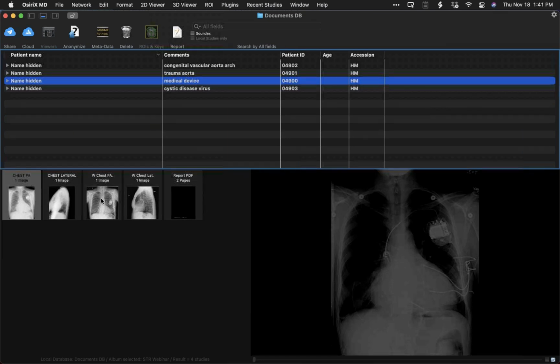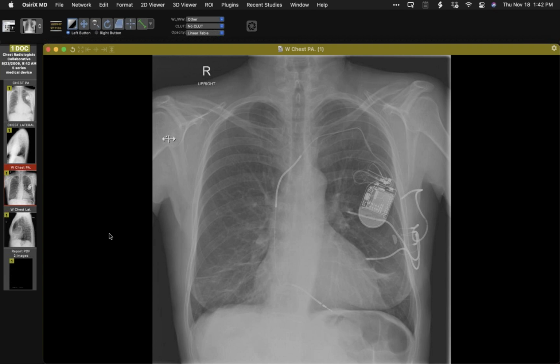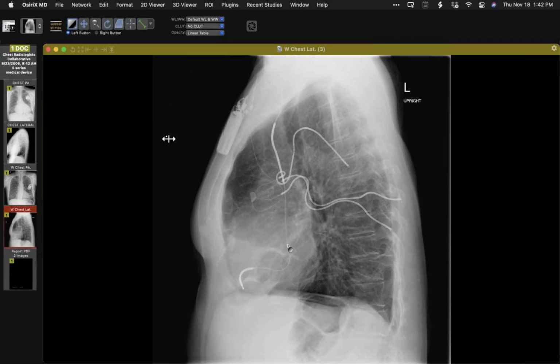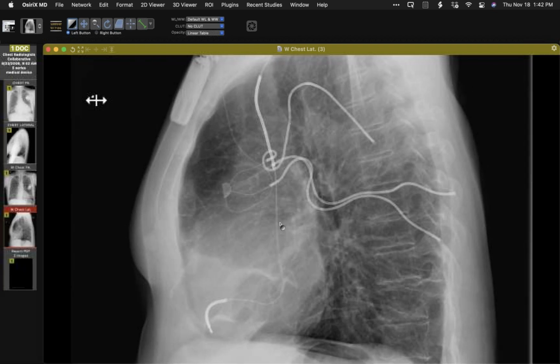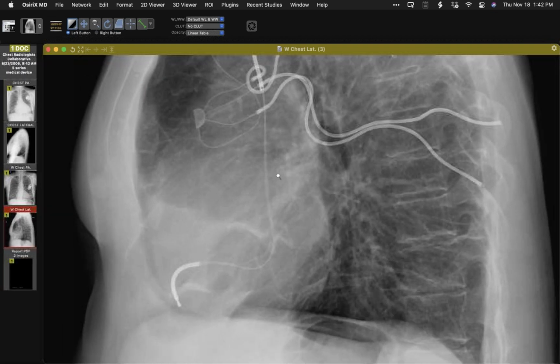This is just a real curiosity. I'll show you the findings which are new from 2006. So the one finding in relation to the one lead is actually easier to see on the lateral, and I've shown one of these cases before.